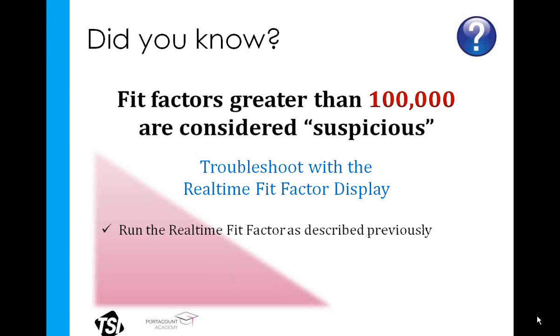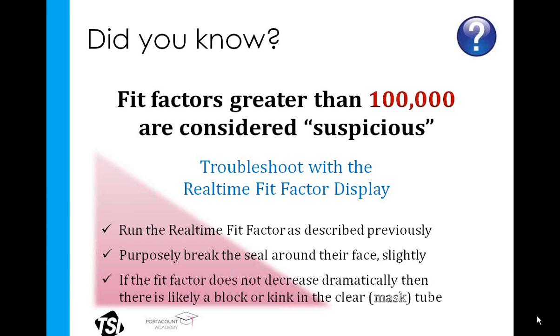Then I would have the wearer of the mask purposely break the seal of that mask to their face. They can do this pretty easily by just sliding their finger between their face and the elastomeric part of the mask, or sliding a pencil in there, whatever you need to purposely break that seal. If the fit factor displayed on the real-time fit factor display does not drop off, then you may have a block or kink in the tubing preventing that sample from being taken.